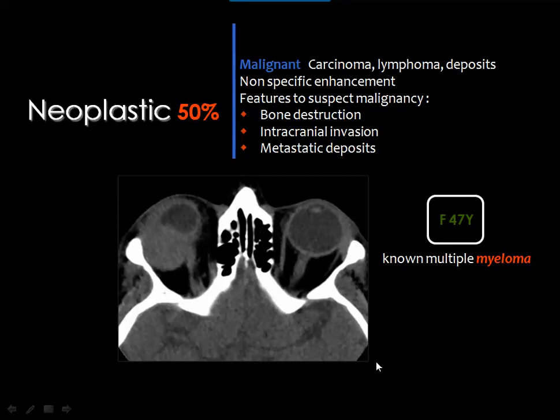Although this is a rare, odd presentation of lacrimal gland swelling, the clinical data are very important to be able to judge the possible underlying pathology. Then if you see a lacrimal gland lesion like this one, and you want to discriminate between benign and malignant lesions, and you want also to discriminate between inflammatory and neoplastic conditions, first of all is to look at the clinical data.